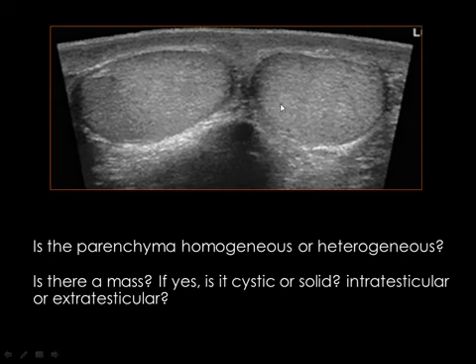When you are scanning testes, think of these questions. Is the parenchyma homogeneous or heterogeneous? Is there a mass? If yes, is it cystic or solid? Is it intratesticular or extratesticular?